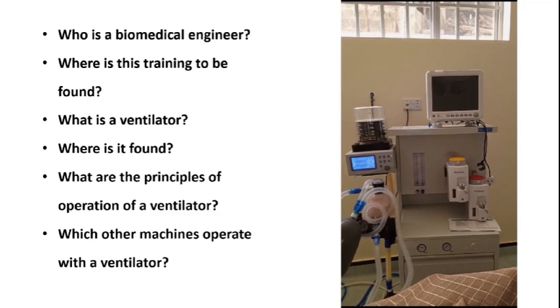So as you have seen from that demonstration, you find a ventilator in maybe a theater or even a ward, an inpatient facility, because that is where a human being who requires assistance in their breathing would be likely to be found. And if you look at all those parts, it has different parts. It has monitors, it has pipes. It is a system, and that system is designed by biomedical engineers.